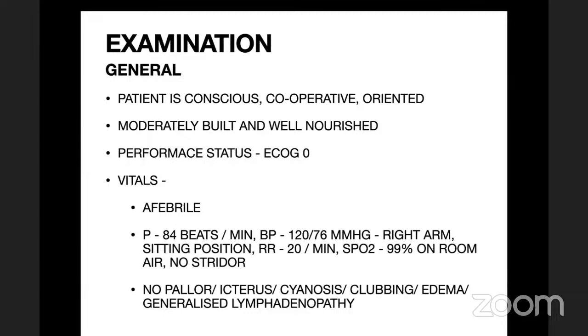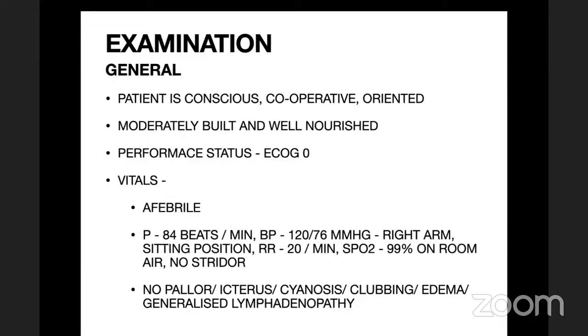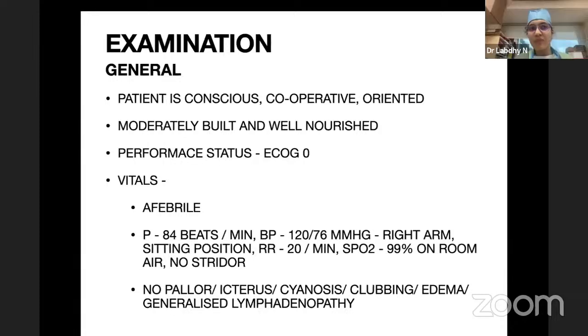I'll just ask a simple question. What do you think is happening here from the history? So this patient has a lesion. He has presented with voice complaints which have progressively worsened, and he's recently developed dyspnea on exertion as well. So I'm suspecting a malignant neoplasm involving the glottis, since the patient presented to us with a voice change first, and there's no history of any foreign body sensation in the throat or dysphagia.